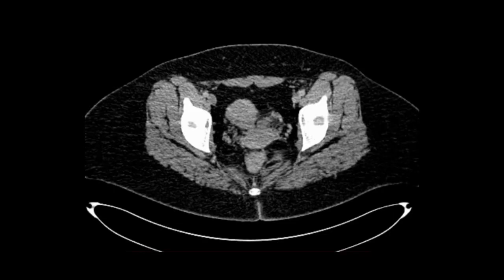Everyone, and welcome to our CT console once again. So we had got a query from some of our viewers to discuss the CT of colon and especially the ileocecal junction. So in this video we will see some cases of colon cancer towards the end of this video, and initially we will see how to trace the colon and rectum. In some cases we may be able to see the normal appendix and the ileocecal junction. So let us dive into our console.